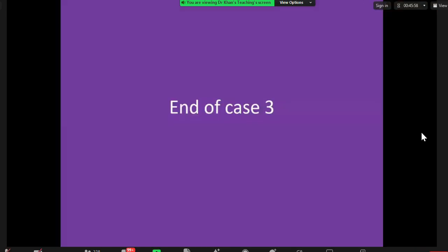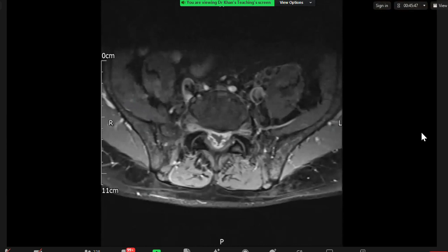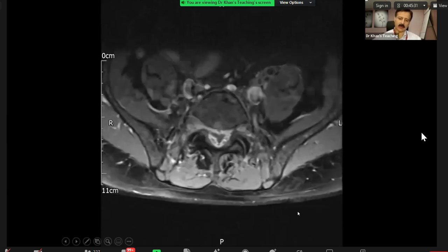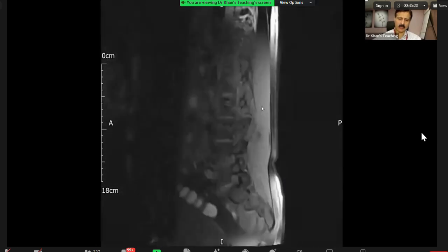Okay, so I can see there are multiple epidural abscesses effacing the Cauda equina roots posteriorly and causing crowding of the nerve roots. Okay, fine, excellent. So basically you have picked up a spondylodiscitis. Okay, let me go through it with everybody.